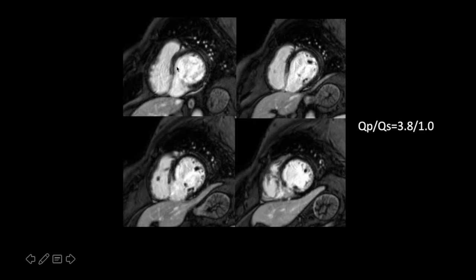So this patient went on to have surgical correction of this aneurysm and VSD post-infarct. But this was completely unknown, quite chronic in nature, and the patient had come in with a non-STEMI and had an LAD stent. So this was a fortuitous discovery. Any questions on this one?